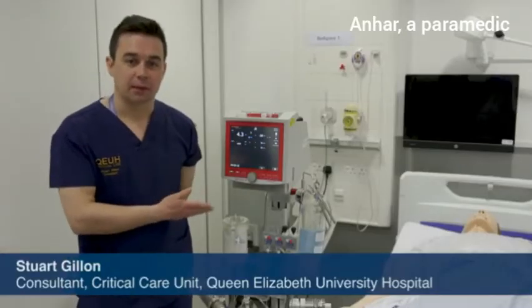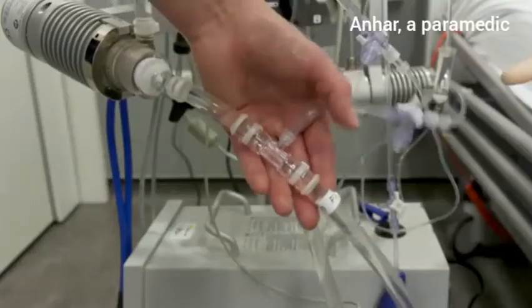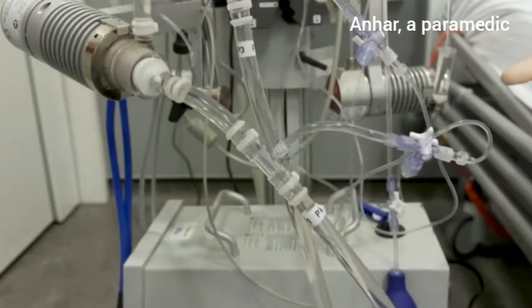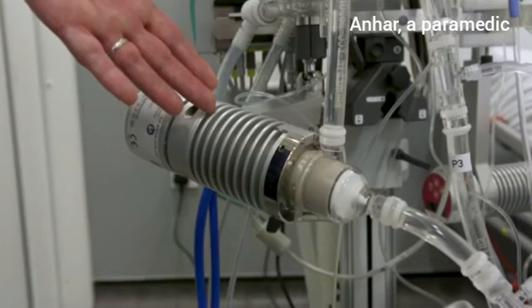This is an example of an ECMO circuit. It consists of 4 primary constituent parts. Firstly, there's an access limb along which blood travels from the patient to the circuit. Secondly, there's a pump which on modern ECMO configurations is centrifugal in nature, and this generates the pressure differential to draw blood from the patient and through the circuit.